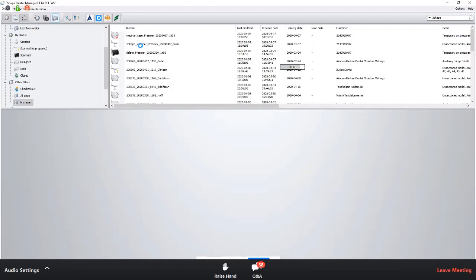And then we can just open up the other case and build a model, so you can see all the new cool features that 3Shape is going to release, probably next month, if I'm guessing right, after the last couple of years. So far, the last information I've heard is that it's supposed to be in May.